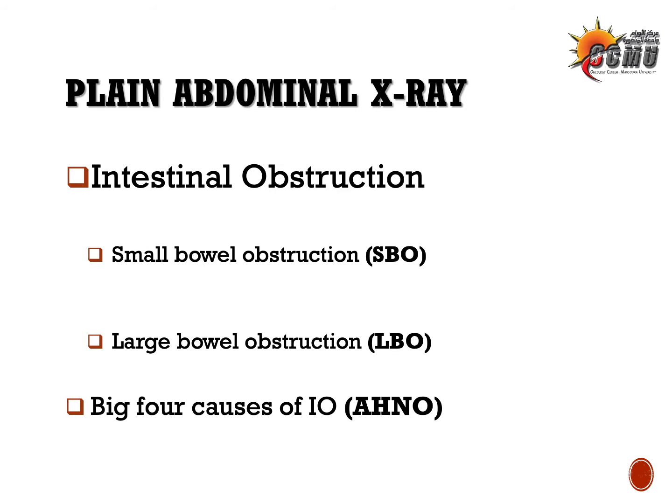Of course, bowel obstruction is mechanical obstruction of the lumen of the bowel, causing stasis of the bowel contents above this obstruction. So the bowel proximal to the site of obstruction will be dilated, distended with fluid and air. And this is what we find abnormally on an X-ray film.